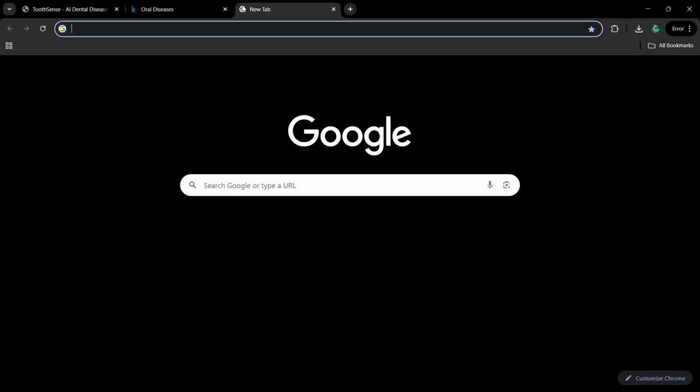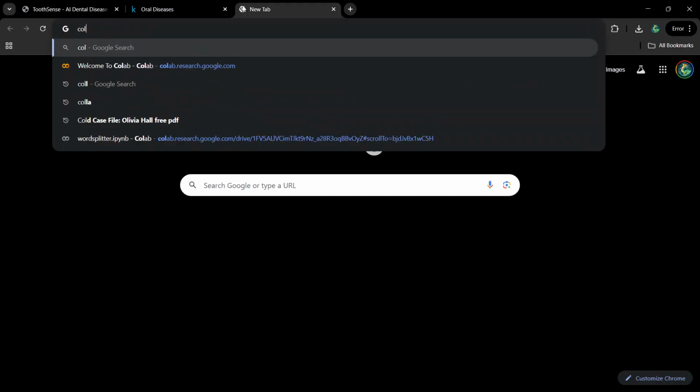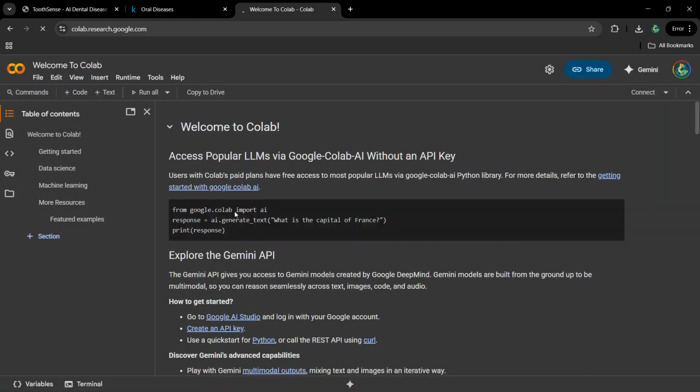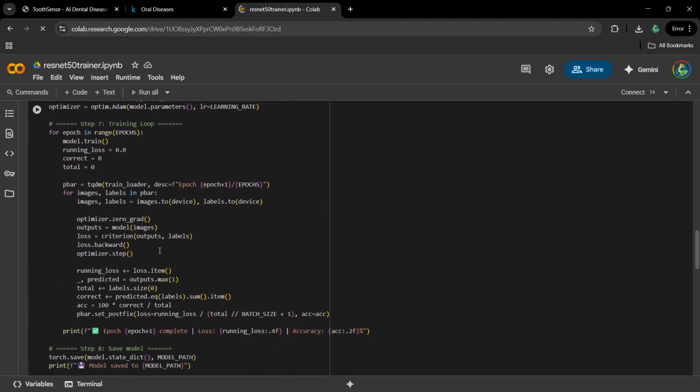And if I would like to show you the training also, the training was done on Google Colab. So here it was where we trained our models, and it will also show you the training accuracy and the training quality. You can check. I'll just show you the results.